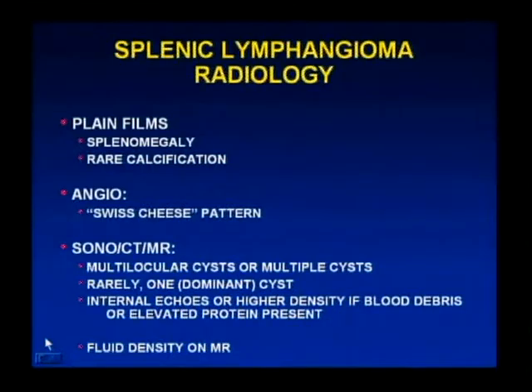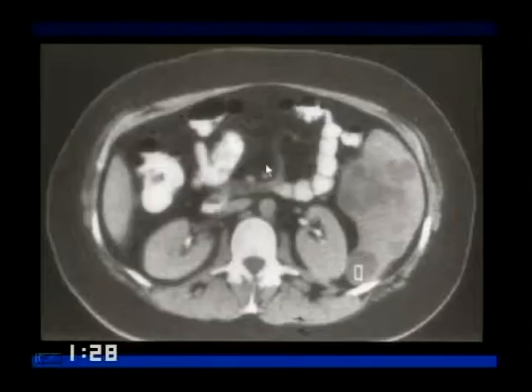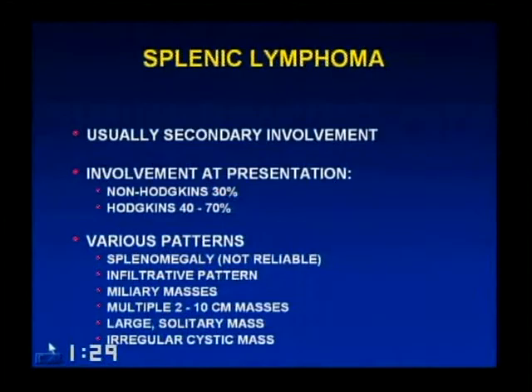Sorry, I do have a lymphangioma to show you from a gross specimen, again from the AFIP files. Very similar micro to hemangioma, except it's filled with eosinophilic staining lymph fluid instead of blood. And here's an old ultrasound with a documented lymphangioma. And here's a CT from the Naval Hospital when I used to be in Washington, D.C., multifocal lesions that was also a proven lymphangioma.